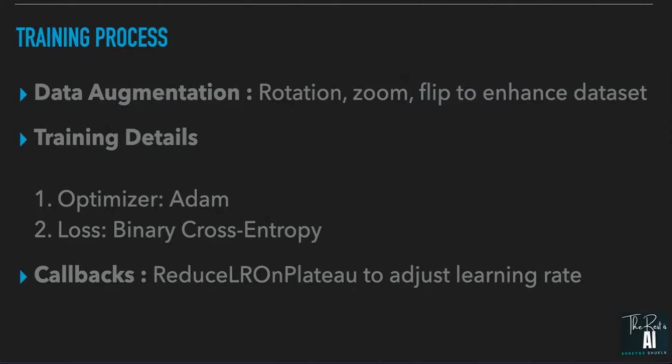We train the model using the Adam optimizer or maybe the RMS optimizer. We'll see that when we get there. It depends on the accuracy that we are getting, but it adapts. That's the Adam optimizer, which adapts the learning rate for faster convergence. The loss function we'll be using is binary cross entropy, which is suitable for two class problems, that is, a binary classification problem.